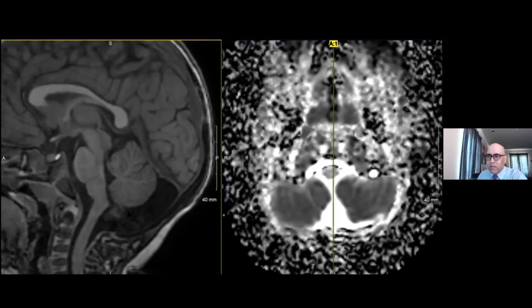An infravermian cyst is a normal variant. Now, this is in a location and an appearance that people sometimes will refer to as a megacisterna magna. But the cisterna magna, the CSF space here, doesn't just get big on its own. It's usually distended because of a cyst. But this arachnoid cyst is a normal variant.